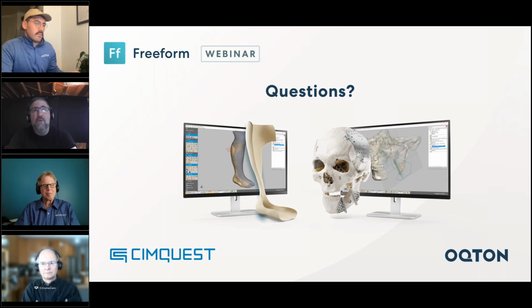Because under the surface we're doing volumetric calculations, and a lot of other things that rely on that data, but the ultimate result is going to be a mesh surface. So what gets rendered on screen is the result of a mesh that is basically wrapped around the volumetric data, which is what gets exported when you go to any other downstream processes. So if you want to export, you're not going to be exporting the volumetric data. You are going to be exporting a mesh surface that is the representation of that volume.